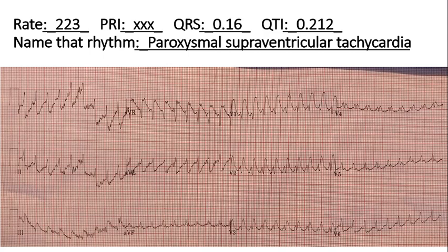Paroxysms are fast initiations. This rhythm didn't start out slow, didn't start out at 70, go to 80, 90, 100, 150, 200. It was going at 70 one second and 200, 230 the next second. It started very fast. And this is similar to the previous torsades that we were talking about, where this electrical activity keeps circulating around the heart. This isn't nearly as bad. There may still be a pulse rate, although this patient really didn't feel good. Diaphoretic, shocky looking, pale, low blood pressure.